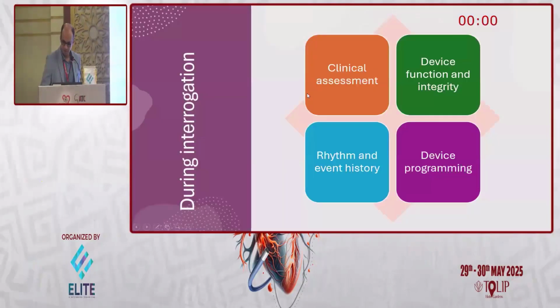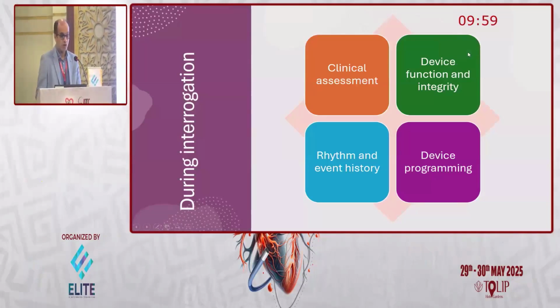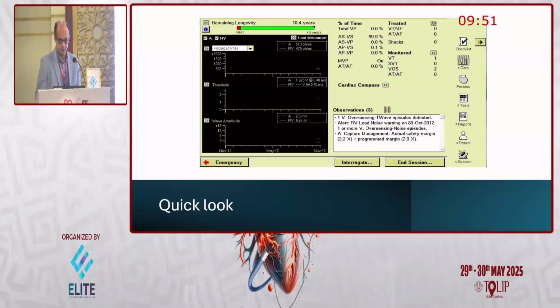We will discuss ICD interpretation. During ICD interpretation, I want to assess the clinical assessment of the patient, the device function and integrity, the events stored, whether with appropriate therapy or not, and redo device programming if needed.